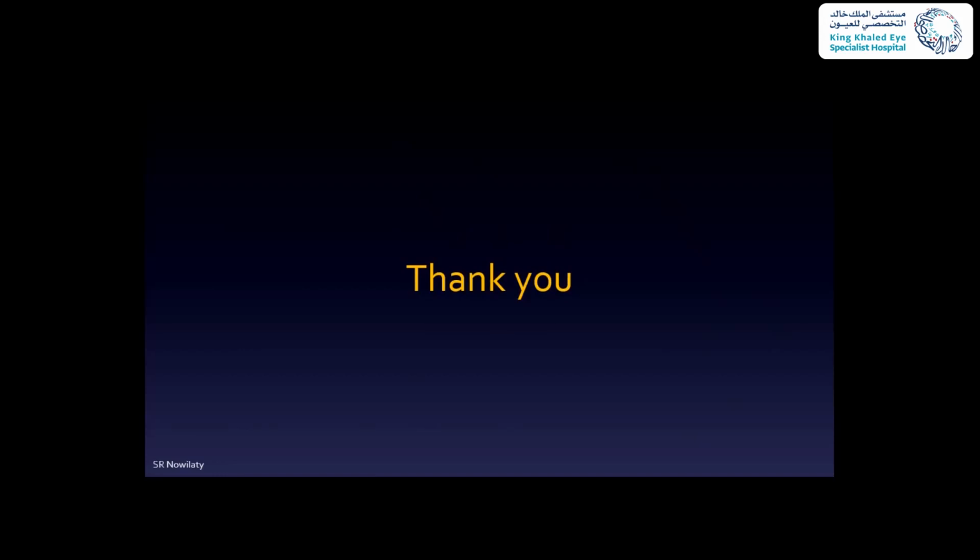If it's very close, then of course it's center involving. And in general, if the map is correct and the segmentation is correct, then the subfield thickness is really going to reflect what I'm seeing.